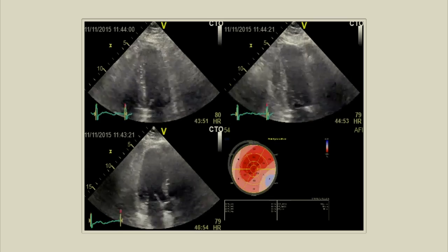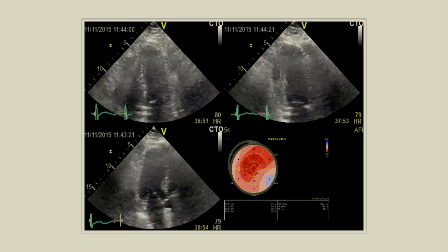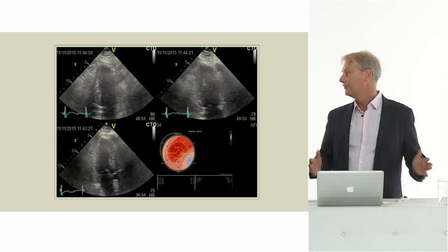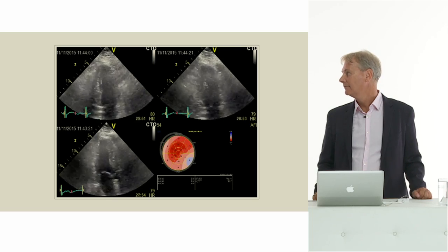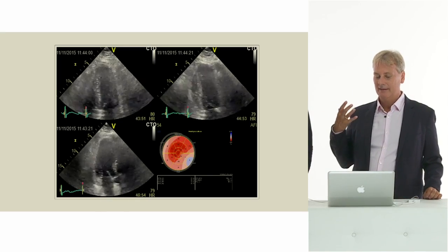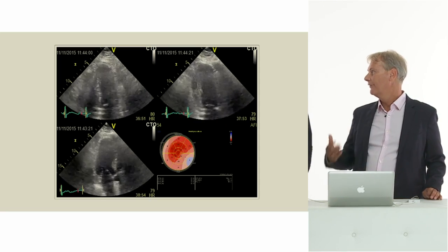Okay, now let's go on with the next point, coming back to the patient that we showed you previously, where we came to the conclusion that there's definitely grade 2 diastolic dysfunction. Now if we take a look at a speckle tracking image, there is impaired systolic function as well. So again, on the surface it's a HFpEF. You can still grade it as a HFpEF, but it's a beautiful example of a patient who has subclinical systolic dysfunction and therefore elevated filling pressures.